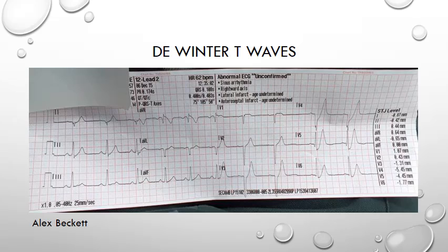So what can we see in this ECG? Well, if we start with a systematic approach, the rate is around 60 and the rhythm is slightly irregular. The axis is rightward and the computer measurement gives that at 105 degrees. There are P waves present before each QRS and there's a QRS after each P wave. So we know this is a sinus arrhythmia.